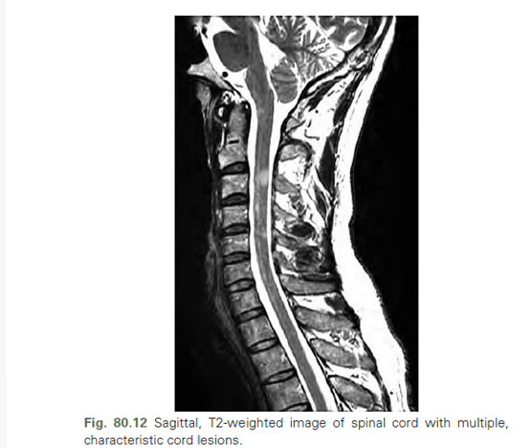Ultimately, a dedicated spinal cord MRI should never be treated as an afterthought or a secondary scan. When you are faced with a tricky or ambiguous clinical picture, such as a clinically isolated syndrome where the brain MRI is borderline or unrevealing, imaging the cord is often your fastest route to diagnostic certainty.